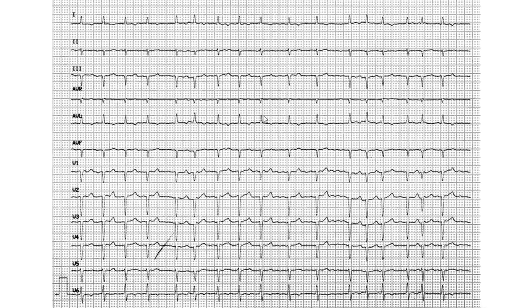I don't see any extrasystoles. Point 3, heart rate, 1, 2, 3. It's tachycardia. I'm going to tell you from now, it is tachycardia. Okay, point 4. Wait a second, sorry, forgot point 2. Is it sinus or not? I don't know if I see any P waves here. Something's going on here. I don't like that. And checking V1 confirms that definitely some funky business is going on here.